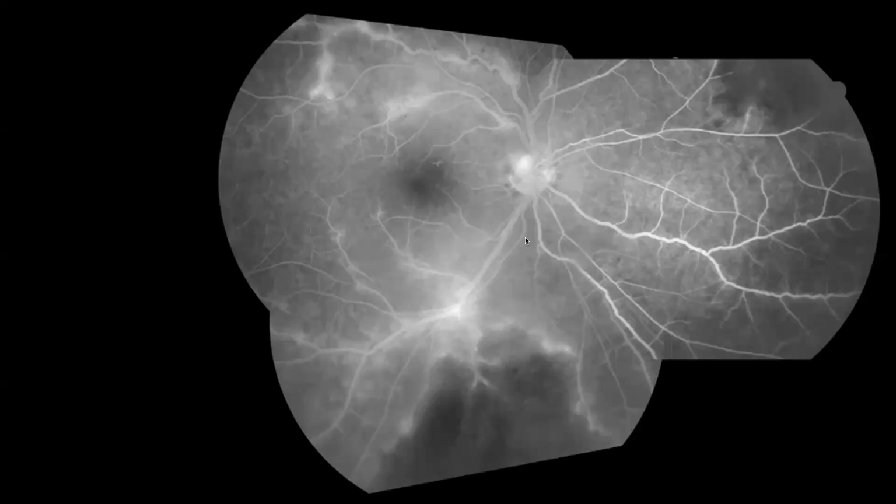Where is the inflammation coming from? Is it from the vein, the artery, or both? Vein. So if you trace it, remember the artery has a smaller caliber, right? So this is an artery. If you trace the artery, its lines are very distinct.